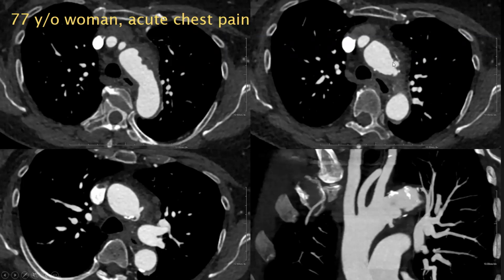If we go a little bit further down, you see ulcer-like lesions, again, protruding into that plaque. And if you go even more inferiorly, one of them penetrates through that expected contour of the aorta and penetrates even through the adventitia in the periaortic region.